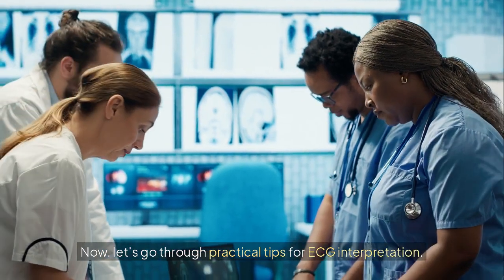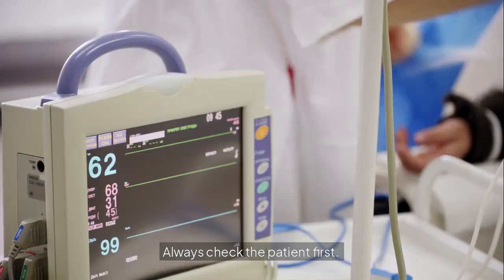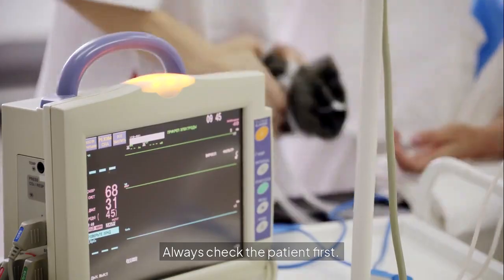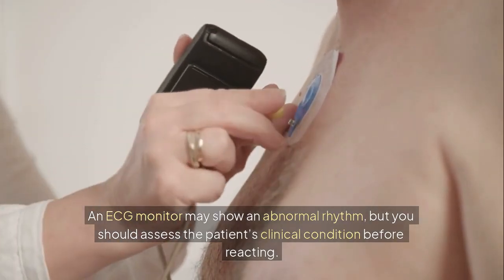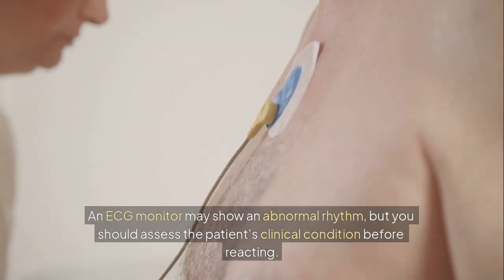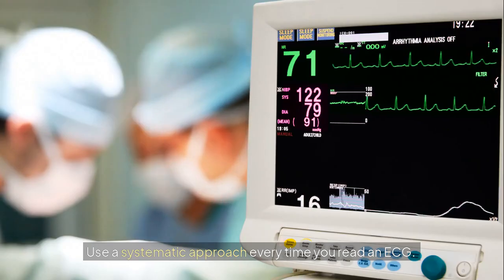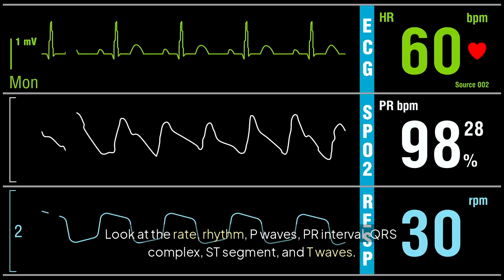Now, let's go through practical tips for ECG interpretation. Always check the patient first. An ECG monitor may show an abnormal rhythm, but you should assess the patient's clinical condition before reacting. Use a systematic approach every time you read an ECG. Look at the rate, rhythm, P waves, PR interval, QRS complex, ST segment, and T waves.